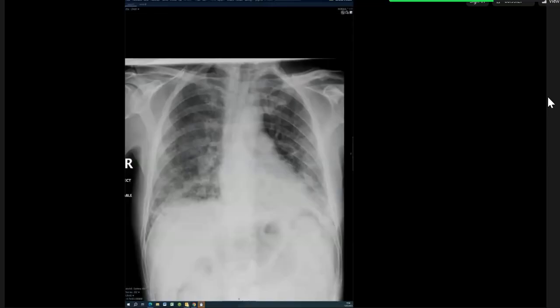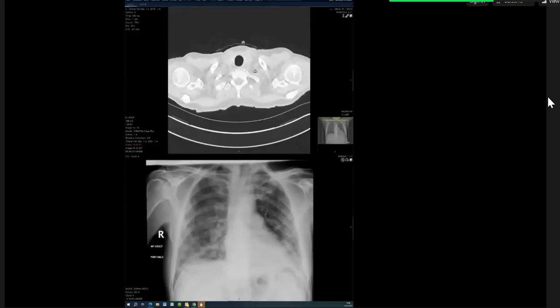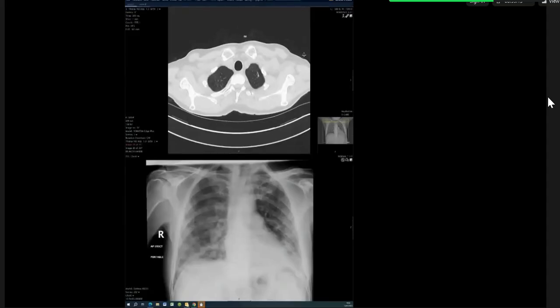Okay. So the patient is well, they only have a cough. What kind of pneumonia do they have? What sort of differential? If the patient doesn't have fever, then it doesn't go well with pneumonia, as pneumonia causes constitutional symptoms. What other kind of process could cause this appearance without giving the patient a fever?